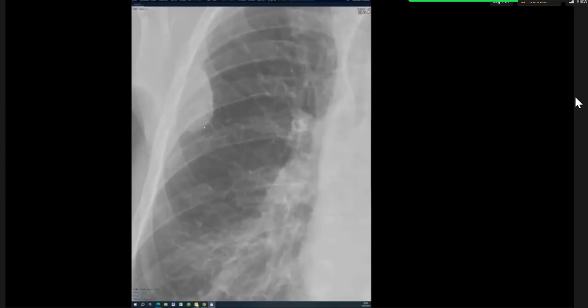So the minute you see an obtuse margin, you want to either call it cancer or not cancer. For that reason alone, you need to stare at the rib really closely, over and under a lesion. Whenever it's peripheral, the margins are quite obtuse, like you said, and well defined, so it's clearly not in the lung. It's either in the pleura or in the chest wall or outside. You have to pick up the bone destruction. It changes it completely, and it's not subtle, it's very clear.